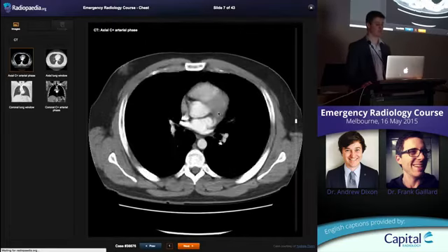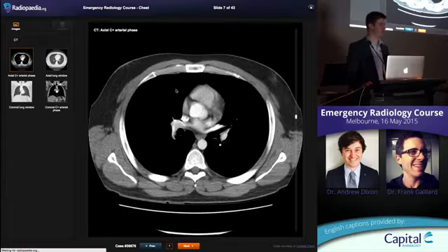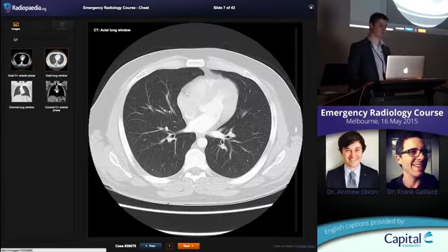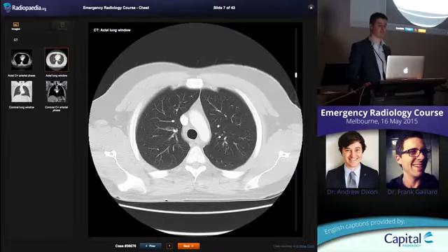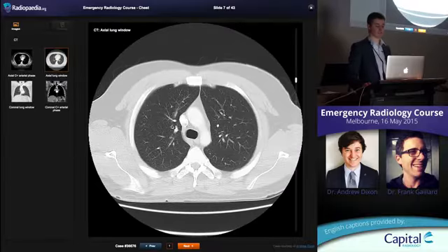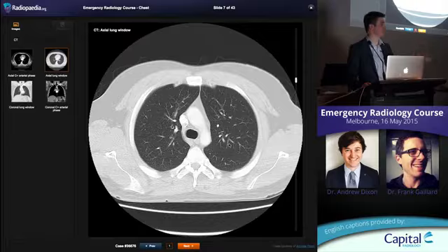So from a CT point of view, I just want to do a little bit of anatomy, but not too much, because it does take some time to learn all of the structures. But in terms of the lung, the lobes, identifying where the fissures are: blood vessels are not going to pass through a fissure, right? Because it's a segmentation between the two. There's a pleural reflection there, okay?